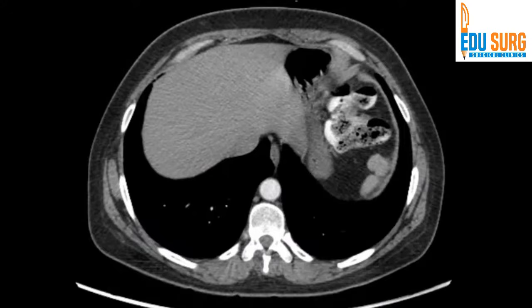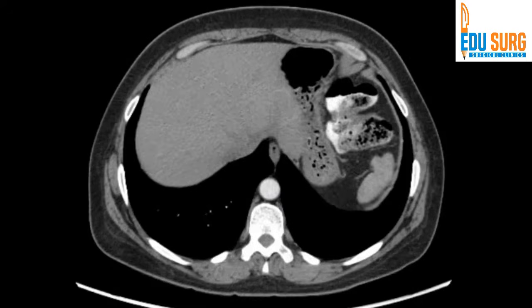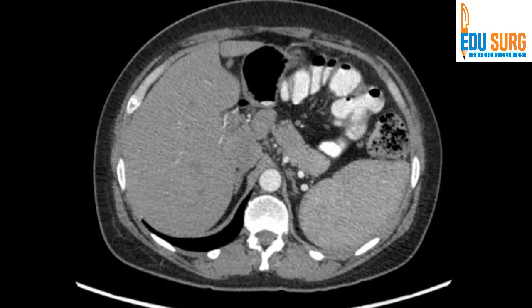A lot of requests were coming for discussing new scans. So today we are going to continue our series Correlate Clinically. This is a very recent patient that we saw in the clinics, and the outcome of this case I will tell you after we have discussed the scan. So first you can go through as always. I will scroll through the entire DICOM.